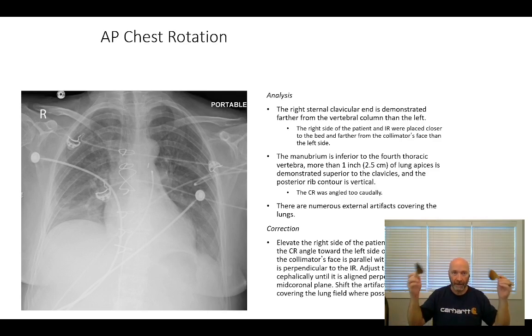All right, so if we've got our clavicles again here, and let's say the patient is kyphotic, what that's going to do is push the clavicles deeper into the chest X-ray. So this patient was not only rotated, but they were also kyphotic, or at least the central ray was not perpendicular to the sternum. It was angled deep into the sternum. So it was angled too much towards the feet.